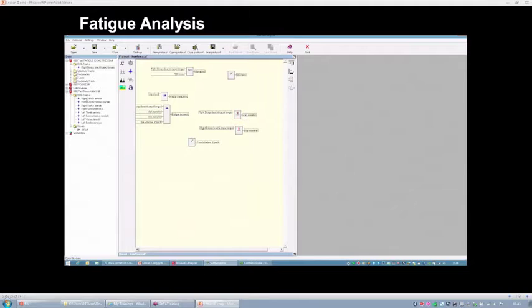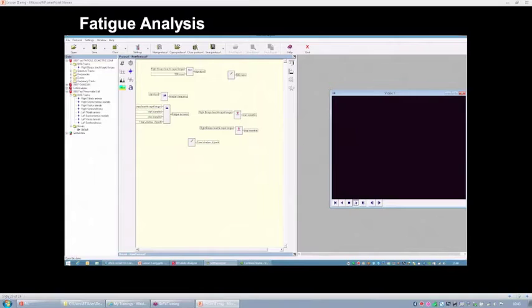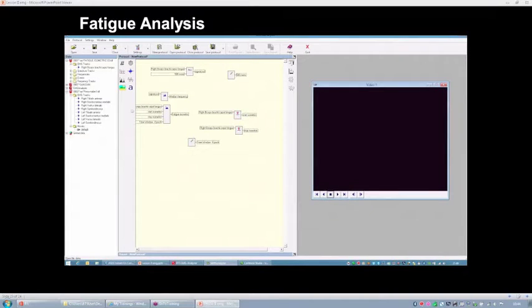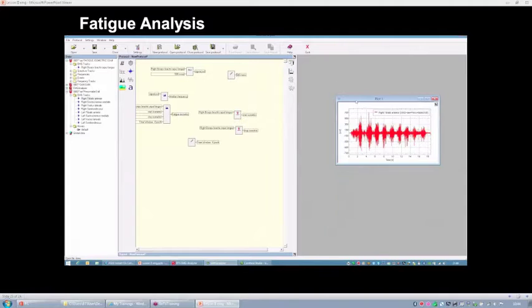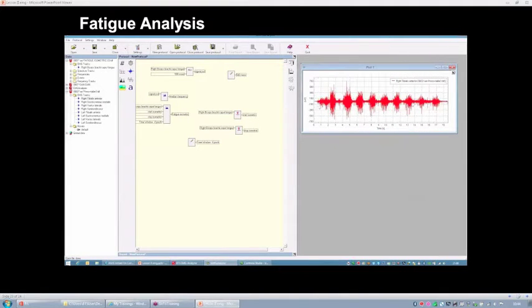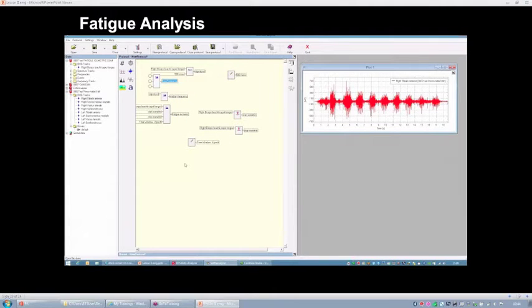Now I want to show you another example. Oh, I'm sorry, I think that maybe you cannot see the video. In this case, I want to show you an example where you don't investigate fatigue during an isometric contraction, but during a repetition of contractions. So in this case, you have two other blocks that can be used to investigate fatigue within the EMG analyzer application. I'm going to use this.